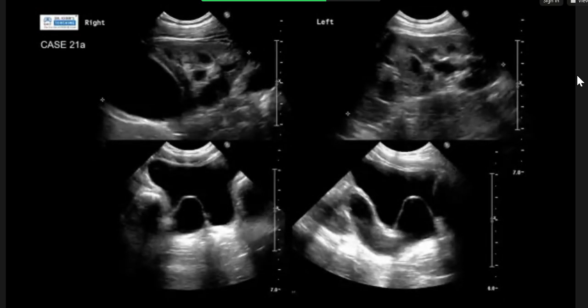And especially, the dilatation is most severe at the upper pole. So these are in keeping with an obstructive ureterocele on the right side, causing upper pole moiety obstruction, and also suggestive of a duplex right-sided calyceal system. Yeah, so that's completely correct. So this is an example of a duplex kidney. So they're actually bilateral duplex kidneys.